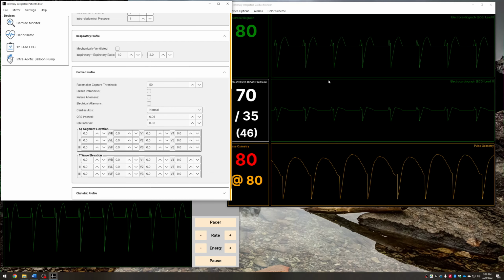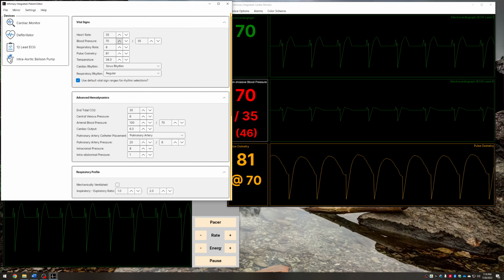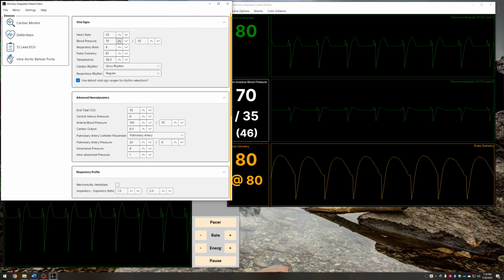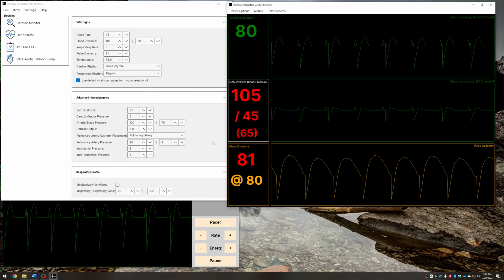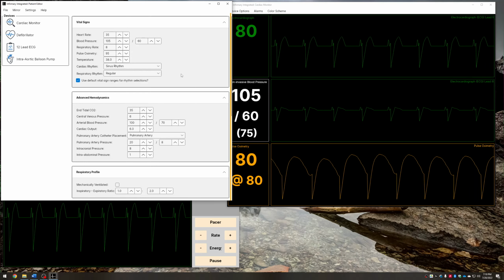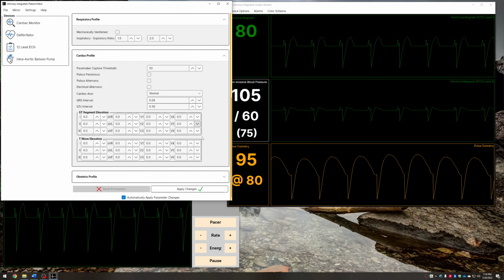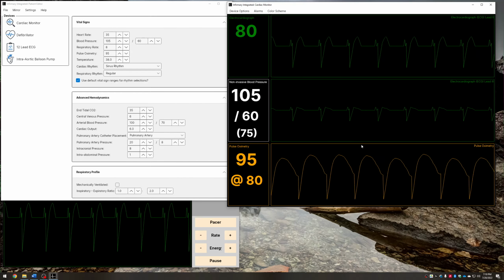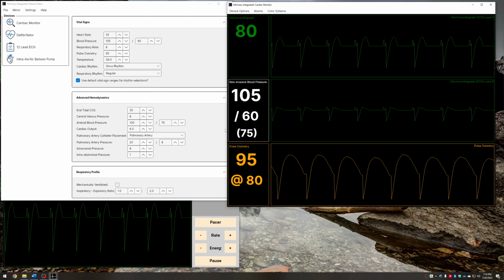So in a situation like this, you would want to be able to respond if the patient were to actually be, for your simulation, responding to this pacing by having a stabilized blood pressure. We could just click up on the blood pressure a bit, and then suddenly it is reflected on the monitor, and similarly with the pulse ox as well. So that is one example of making rapid-fire changes to the patient model with the auto apply parameters enabled and having it very rapidly show a patient improve or decline on the simulated devices.